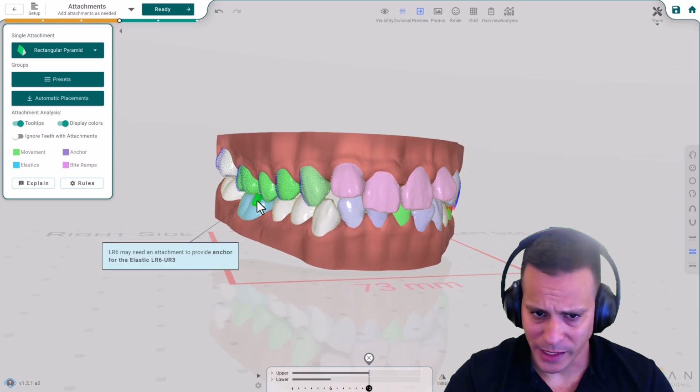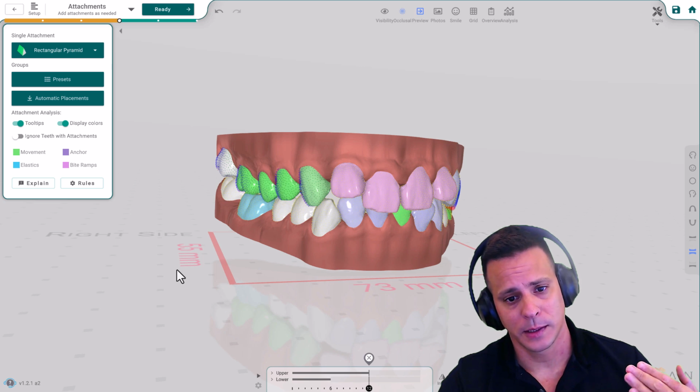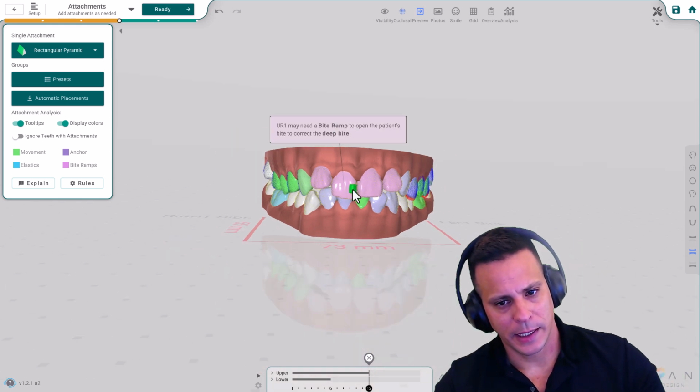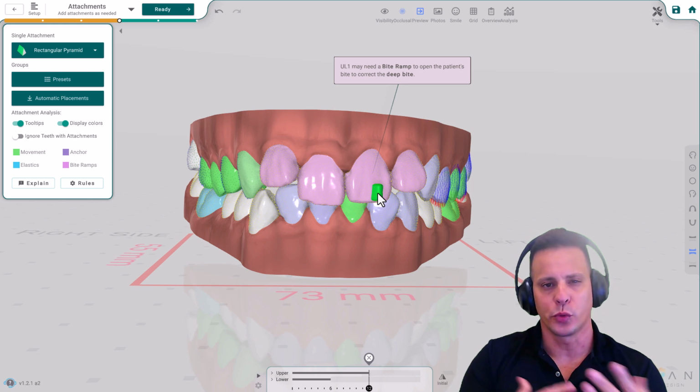And by elastic, you can put anything, just a precision cut. You can put a button, some things. And we go even further. This is great, but everybody has their own protocol. Everybody has their own rules.